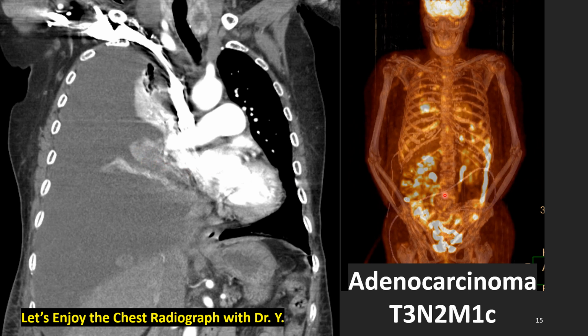Let's look at the PET-CT image. Tumor mass with multiple hot uptakes, maybe lymph node, maybe pleural seeding. And on the left side, also there are several hot uptakes. This means distant metastasis. So her right middle lobe adenocarcinoma with T3, N2, M1c staging, far advanced stage.